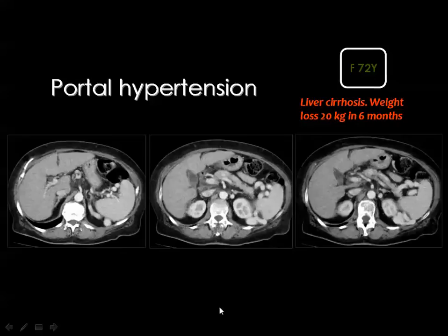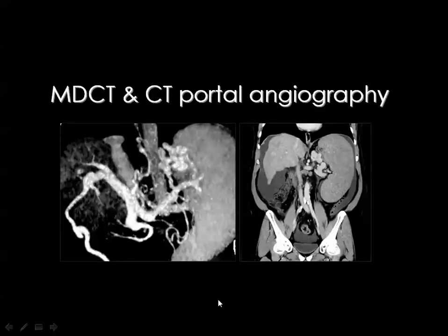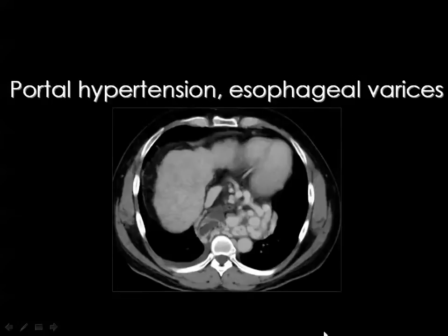Then the issue of portal hypertension, as I have said, will be discussed in the splenic lecture, and you see here dilated portosystemic collaterals around the spleen, and also they can be seen at the gastroesophageal junction, representing portovenous collateral channels. And this is CT portal angiography. The liver is shrunken, the spleen is large, and you see esophageal varices at the gastroesophageal junction. The coronal reconstructed CT image shows dilated portosystemic collaterals at the splenic hilum.